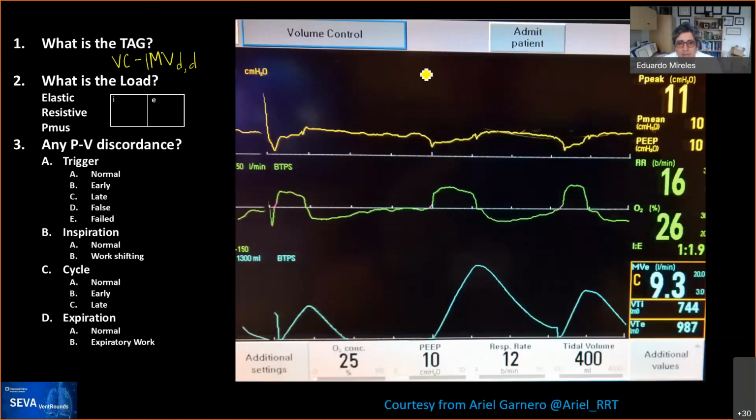It looks something like this inside a little square, and then it has these little dots on top. And that's called flow adaptation. So why do we know that that's it? There are actually pretty cool images here that help us identify that. So thank you, Ariel, for sharing this.